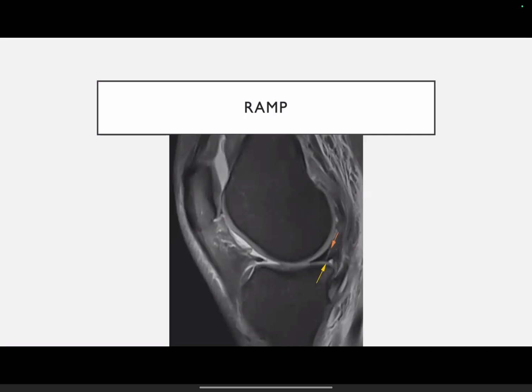You need to inform your arthroscopic surgeon or the knee surgeon about this, because this will not be seen on the normal scopy. And even after the reconstruction, if we don't address this, this can lead to ACL reconstruction failure. So whenever you see a medial meniscus tear at the meniscocapsular junction involving the meniscotibial attachment or the femoral attachment, we need to at least raise a concern for a ramp lesion so that they can guide their scope back along the posterior horn, because that's not very commonly, easily seen, and then they can go and repair if it's the case.